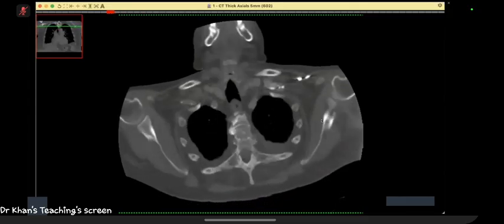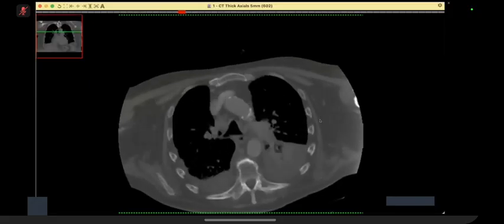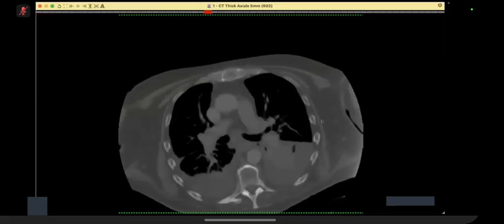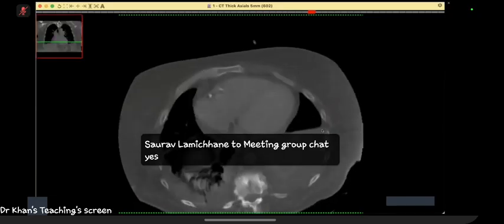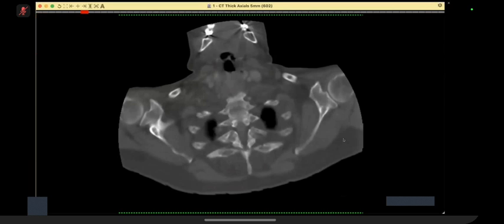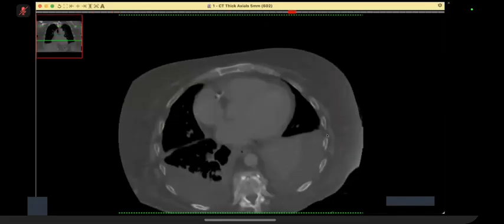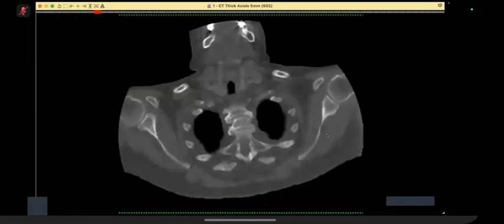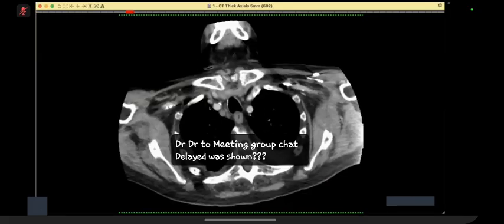Okay, I'm looking at the bone sections. From up to down, I can see that there are some osteoarthritic changes which are normal for that age. I do not see any obvious rib fractures. However, in the abdominal section, I could see that the liver was going anteriorly through at the edge of the film.